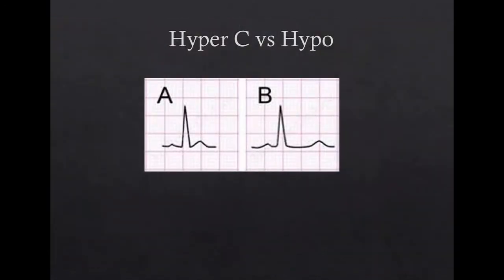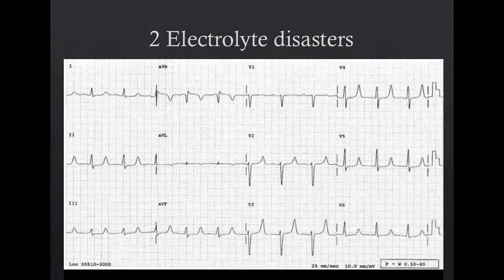All right. Just to remind you, hypercalcemia pulls in, hypo pushes out. All right, for a prize, can you guys give me 2 electrolyte disorders here, and can somebody also tell me why?